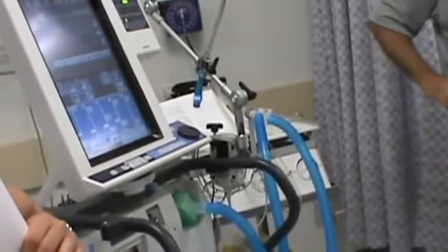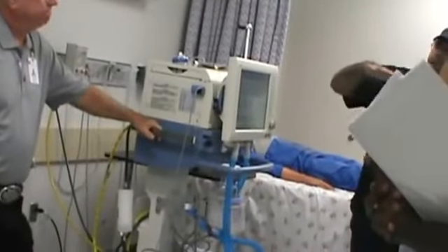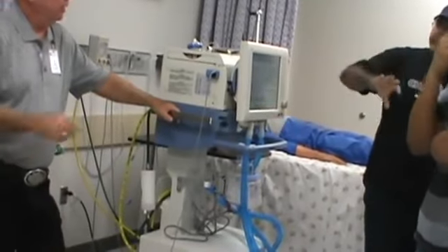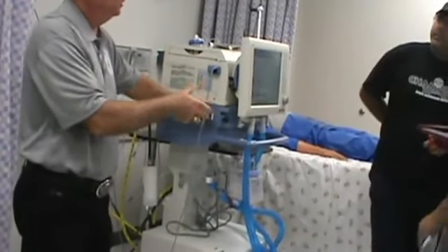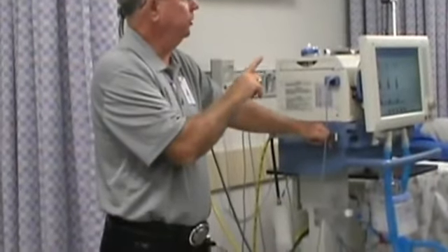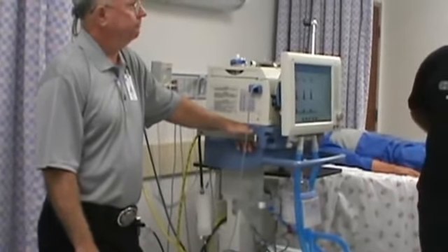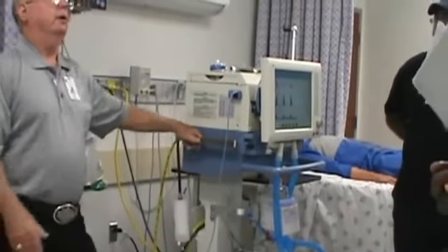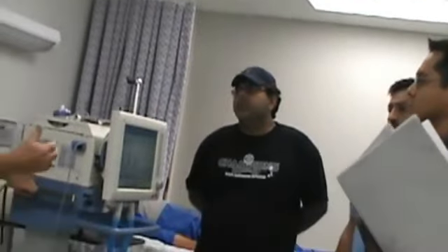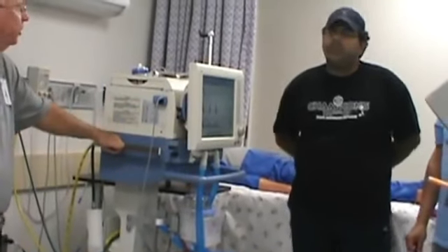Put down your toy. If your patient is kind of, you know how sometimes they'll fluctuate, the pressures will stay at, you know, 5 to 7. What do you do? You just take the highest one and work with that? Well, no, when they're fluctuating, they're on SIMV. What's fluctuating is their tidal reading. As far as the machine volume, you should be within 1 to 2 centimeters of water. But as far as even the pressure, sometimes if they're shifting or they're coughing, then the pressure varies. I'm saying if they're not completely sedated, watch for what the pressure is at the point in time they're not out of sync with the vent, and that's the pressure you want to go to.